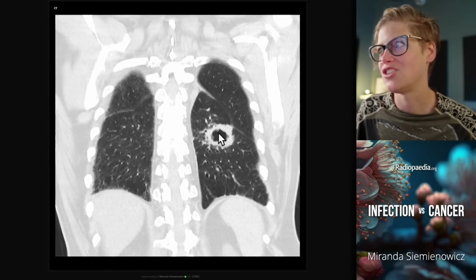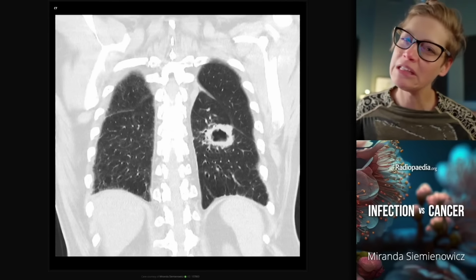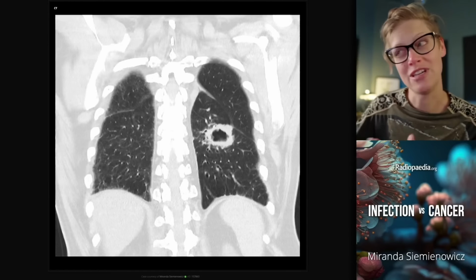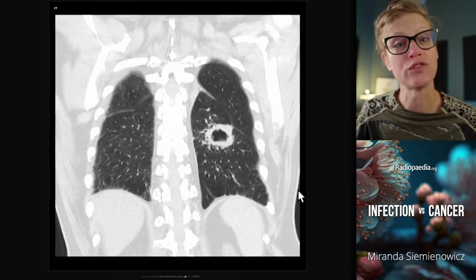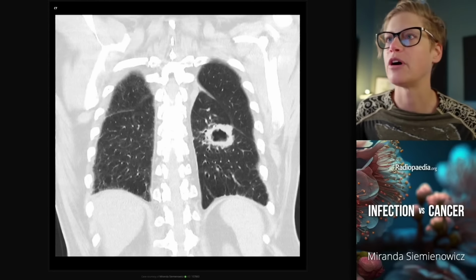In fact, the interior margin is also microlobulated, which you don't often see. Very commonly, the cavity within a cancer is smooth and well-defined. Here, this is some fortuitous, rather delightful microlobulation within. But these are features of a cancer. Oh, look, the fissure is drawn in. Well, we know how much to think about that.